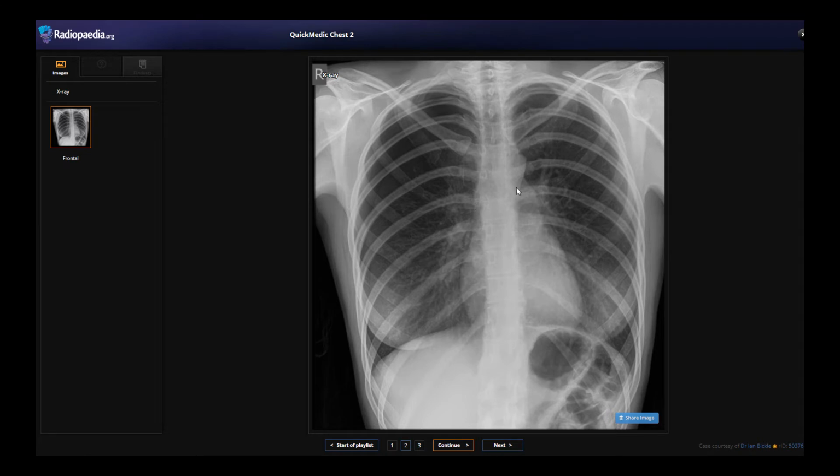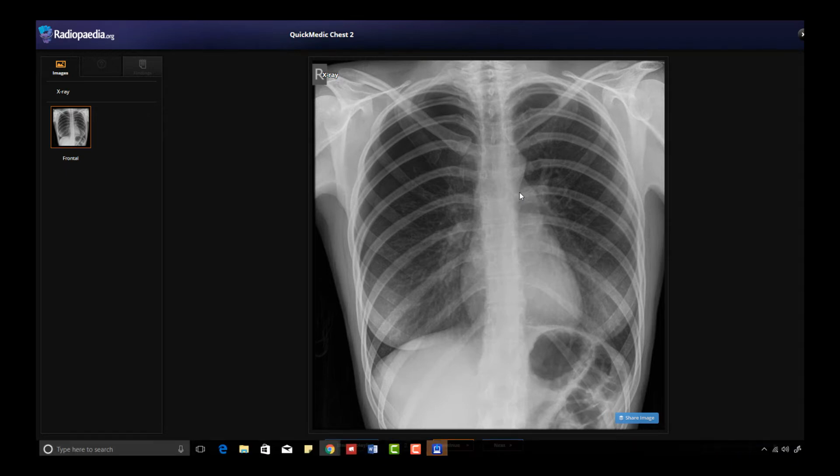So, we're always going to refer back to our original x-ray video on how to read a chest x-ray in 5 minutes with our ABCDE approach. And that means the airway, the breathing, circulation, disability and exposure. Airway, the trachea and its branches. B, breathing, the lungs and the pleural spaces. Circulation for the cardiomediastinum. D, disability, the bones, think fracture. E for exposure is everything else, really. So let's start with that.